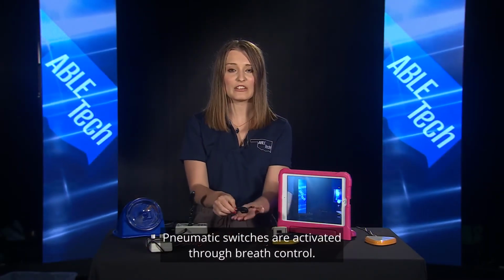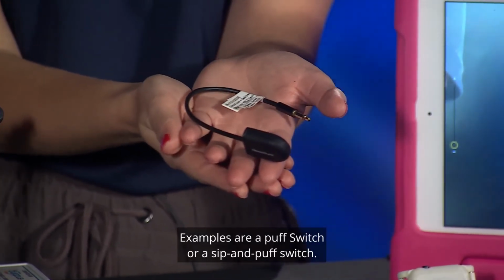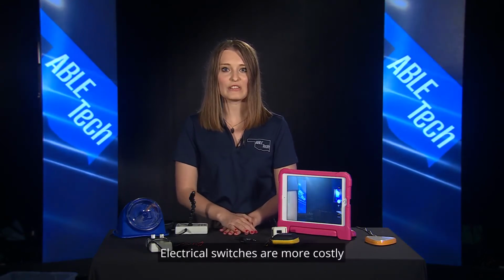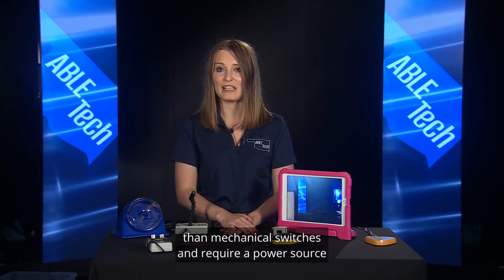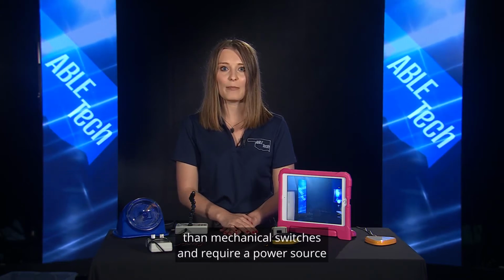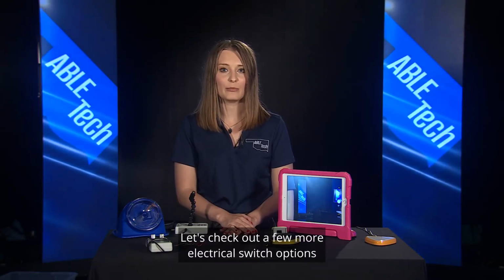Pneumatic switches are activated through breath control. Examples are a puff switch or a sip and puff switch. Electrical switches are more costly than mechanical switches. These switches have fewer somatosensory feedback effects than mechanical switches and require a power source such as a battery or electrical outlet. Let's check out a few more electrical switch options available in AbleTech's short-term loan program.